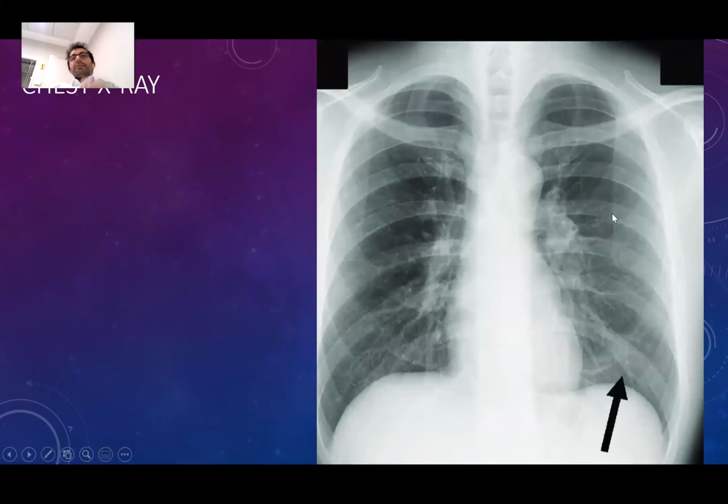Let's look at this patient. Systematically: no rotation, good dosing. Dosing is good. No angulation. 1, 2, 3, 4, 5, 6. I counted the front ribs. In 10 seconds, I completed the technical evaluation.